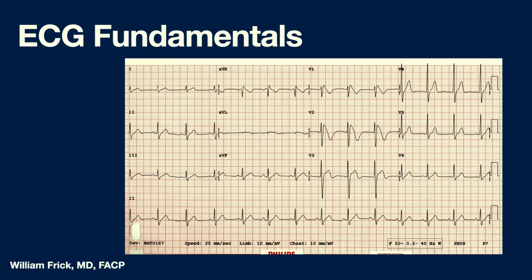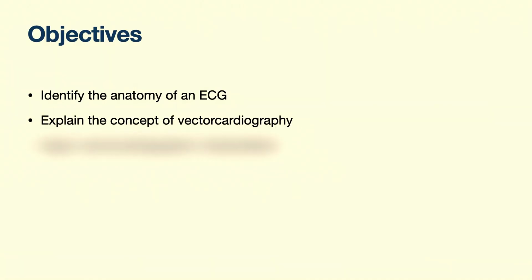By the way, I should have asked, just for fun, any ideas what this ECG is? It's kind of a pattern recognition thing. You've either seen it before or you haven't. Is it Wellens? That's a good guess. That's the other differential. Very, very good guess. Brugada, yeah. So Brugada is an inherited arrhythmia syndrome. It's a sodium channel mutation classically identified by this kind of, they call it the saddleback ST elevation in V1 and V2. So it's a fun little ECG. That'll come up again.